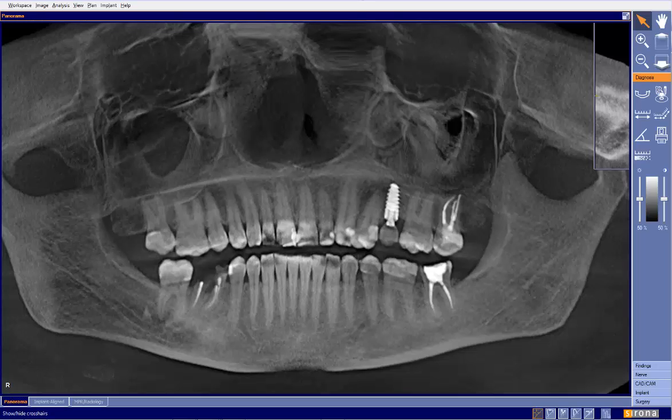Hello. I wanted to take a chance. This is a patient from my own practice who we saw, and I wanted to show us the power of 3D imaging. In our office and in many offices, we're taking 4 bite wings and a Panorex. In our case, our Panorex also happens to be a 3D scanner, so we have some more abilities with it than the normal person with the Panorex.